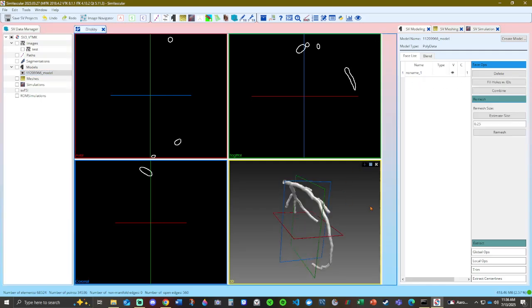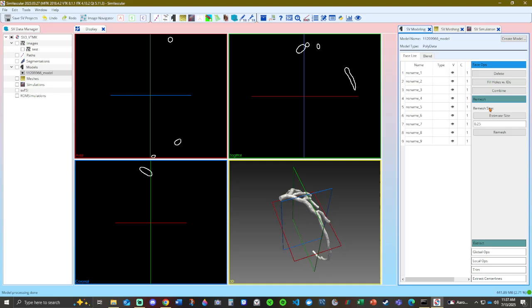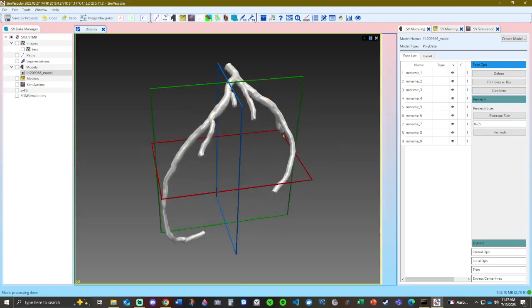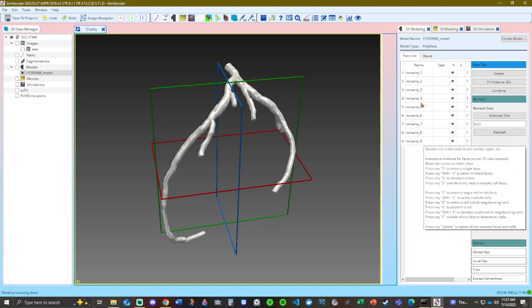So the reason I say not to extract the caps in 3D Slicer is because when you get here, you have the option to just fill your holes using that option right there. And this is much better because in some cases, when you bring in an STL file that you just worked on, it'll normally come with a whole bunch of other parts of the vessel.